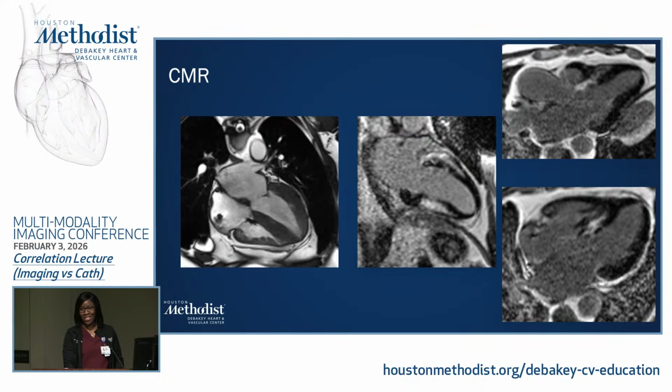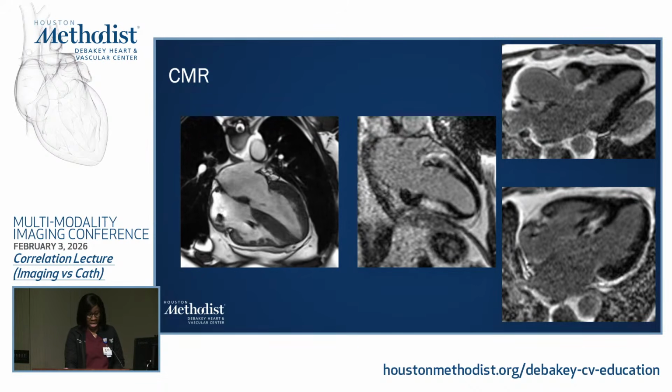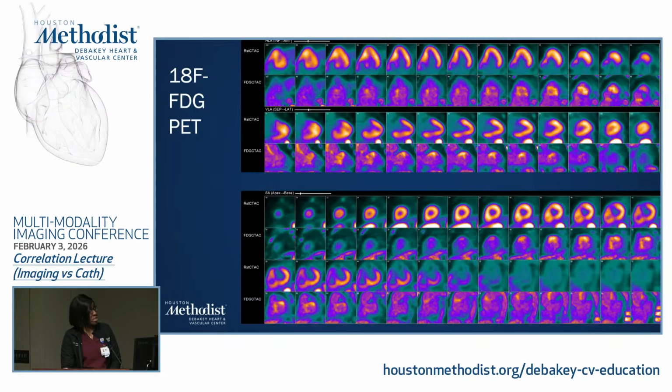It seems obvious, but I think we keep an open mind. Yes, everyone has thought of cardiac sarcoidosis, and this looks like cardiac sarcoidosis, but it could also be other things. Myocarditis, very bad myocarditis, could present this way, as could arrhythmogenic cardiomyopathy.